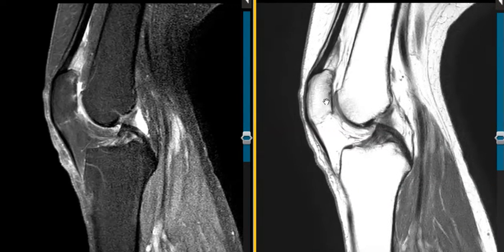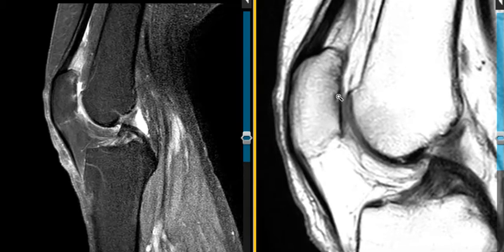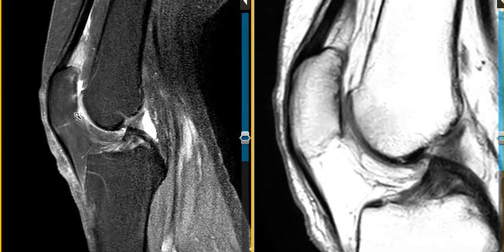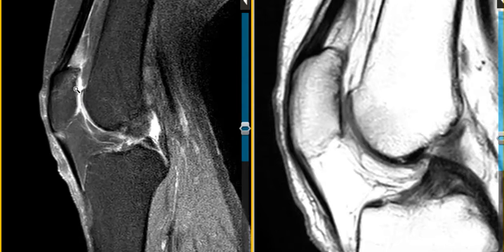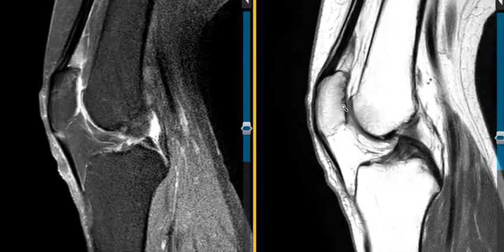There's a few little tiny areas of irregularity right beneath the articular surface. Those are little tiny cortical erosions. Here and here, the cartilage is very thin. Normally we have a thick rind of gray cartilage across the surface. Instead, the cartilage is very thin, and we have little cortical erosions and a little bit of edema underneath. So this patient has some chondromalacia patella that is contributing to her anterior knee pain.